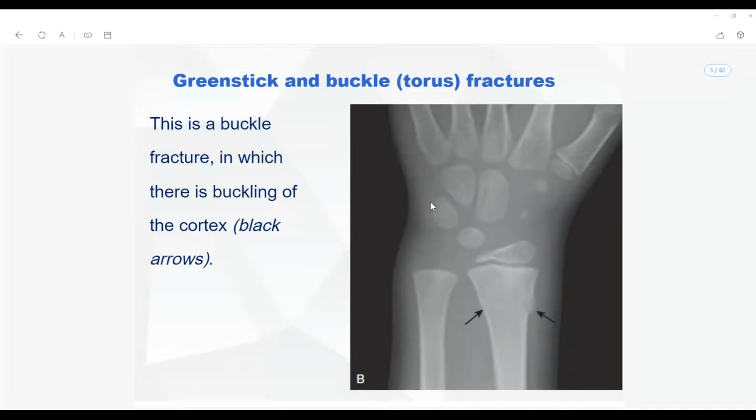So that's the reason they are ossified below the age of 5 years. And the pisiform bone generally gets ossified at the age of 7 years or so. So you can say that this baby is something around 5 years. That is how we try to guess the age of a person.